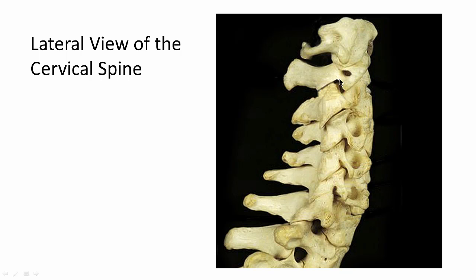So C2, what can we see? We can see an inferior articular process, which has the inferior articular facet on it, or articular surface or hyaline cartilage. Together this makes up what's called the lateral atlantoaxial joint. Lateral atlantoaxial joint. Now we have a spinous process and a lamina. We're going to see a spinal laminar line, which is very important.